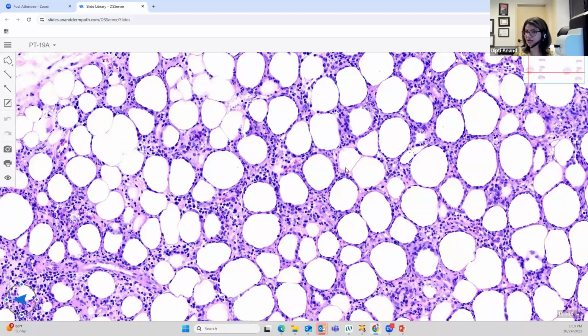Or do you have precipitated triglyceride crystals, which will make you think about subcutaneous fat necrosis of the newborn? Does it have a lot of lymphocytic rimming with the dirty fat necrosis, which will make you think about subcutaneous panniculitis like T-cell lymphoma? Or is it non-discrete, involving the septum and the lobule with fat necrosis, with everything happening hand in hand, which will make you think about traumatic etiology?